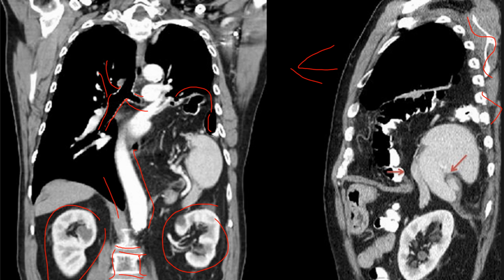And so one of the things that you're seeing here, and this is a good example, I've seen a lot of these patients, this is a herniation through the diaphragm. So this is in adults, and then here's the diaphragm on the picture on your right. I'm highlighting it right now. And you can see there's this little hole, and then things have herniated through into their thoracic cage. And that's what you're seeing here. You're seeing some herniation into the thoracic cage that's restricting that left lung from expanding.